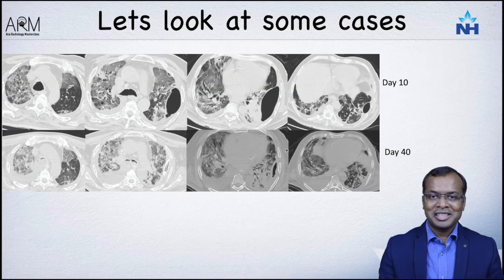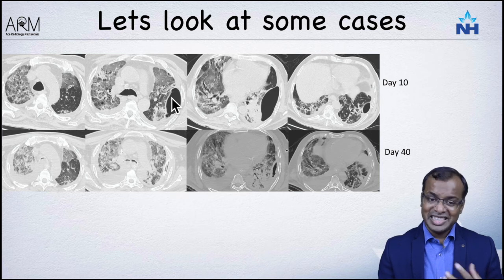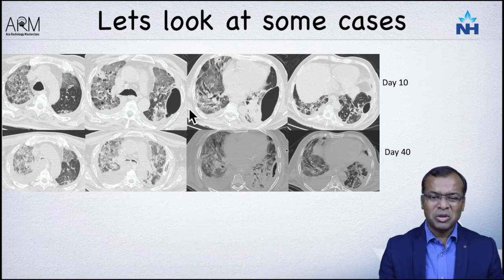This is one case which I am extremely proud about and extremely surprising when you look at this. This was one of the cases which was with us for a long period of time. You can see this patient had extensive involvement. He had developed a loculated pneumothorax which we had drained over a period of time. Extensive involvement, pleural effusions, cardiac complications. There were lots of issues in this patient.